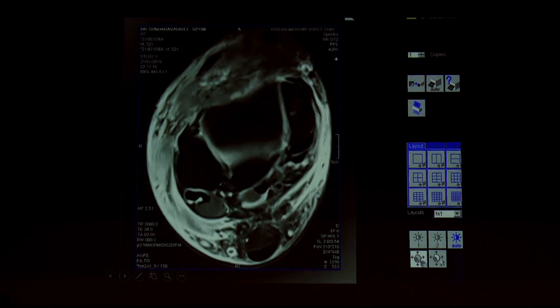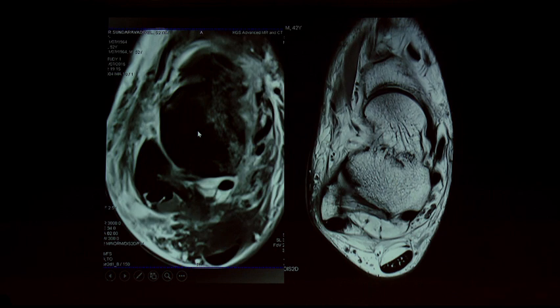And the next high ankle is anterior tibiofibular. You can see, along with the bony fragment, complete rupture. This is anterior tibiofibular high ankle ligament injury. And this is low ankle. You can see the anterior talofibular totally gone.